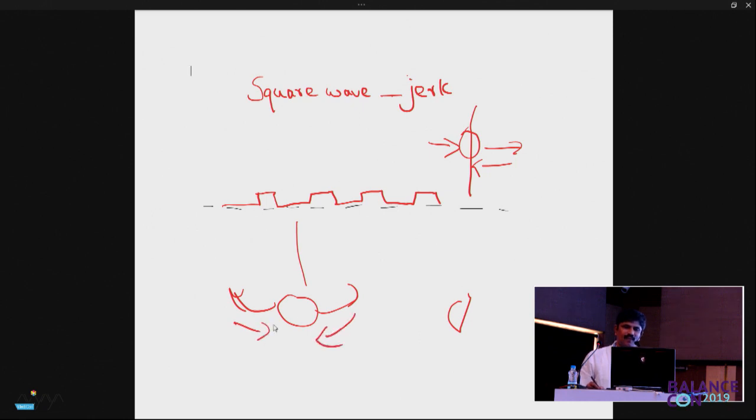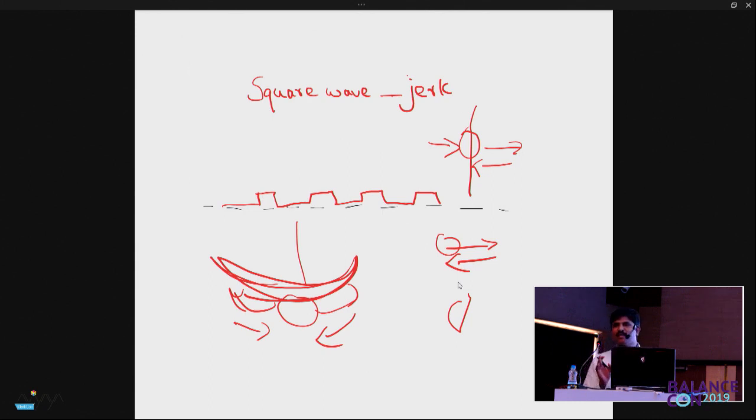It goes this way, then this way, then comes back. But if from one place it is just sent to one side and then comes back, it is called a jerk. So we should know the difference between the jerk and the oscillation so that we know the further words. Shall we continue? We are all together?